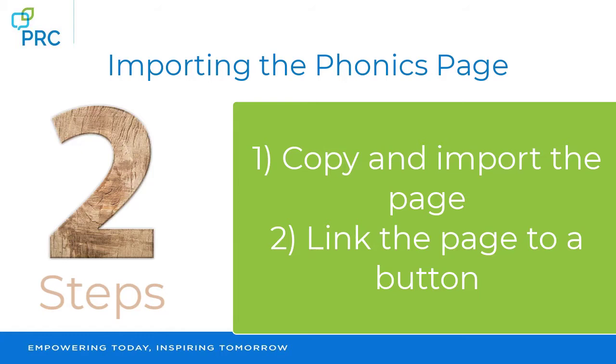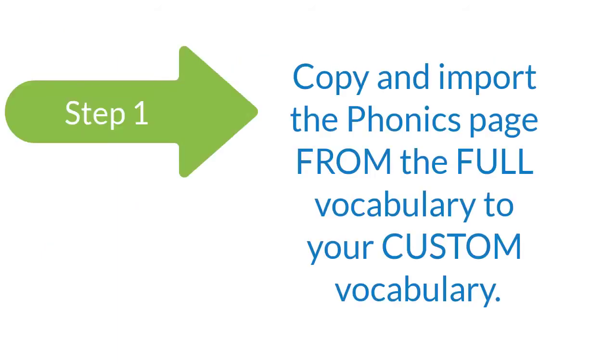Follow these 2 steps to import the phonics page. First, you'll copy and import the page into your custom vocabulary. Then you'll link the page to a button on your spelling page. Step 1. Copy and import the phonics page from the full vocabulary to your custom vocabulary.